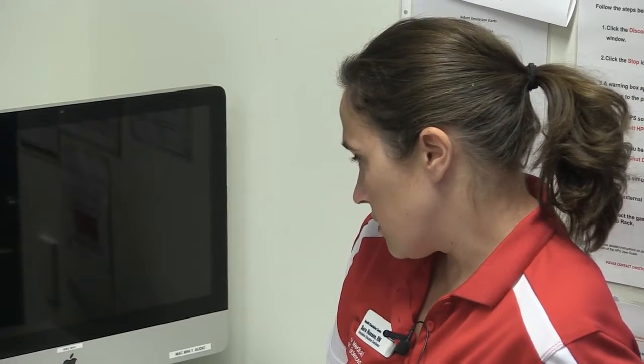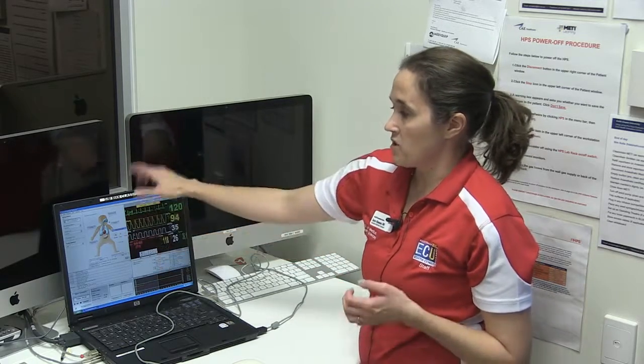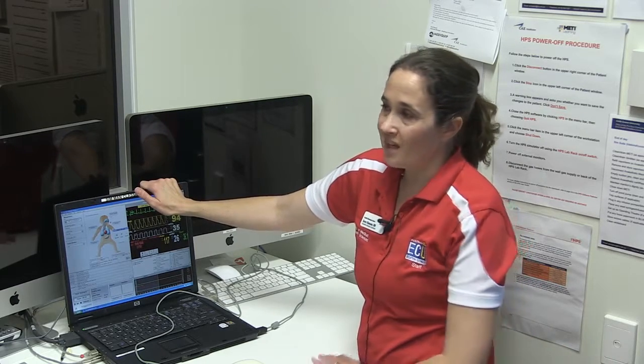Let's see if there's anything else that I want to show you. I'm just showing you the stuff that I utilize because, like I said, with the mannequins, there's a ton of features. You'll have to suss out what works best for your needs. The information that I've just given you, and hopefully Holly's given you, gives you the basic understanding and the basic start of using it. And then there are other capabilities available to you. But even with a mannequin at 100%, you're probably not going to use 100% of its capabilities at one time. We really focus on the methodology.